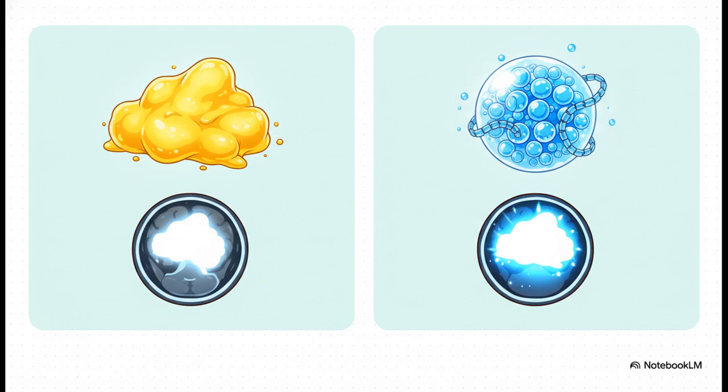Next up in our lineup, we have two suspects that can look kind of similar but are totally different on the inside. The dermoid cyst is essentially a sac of fat. And since fat is bright on T1 images, so is the dermoid. The epidermoid cyst, on the other hand, is a sac of trapped water and skin cells. That trapped water can't move around freely, and that causes something called restricted diffusion, which makes it light up like a light bulb on a special sequence. So one is bright because of fat, the other because of trapped water.